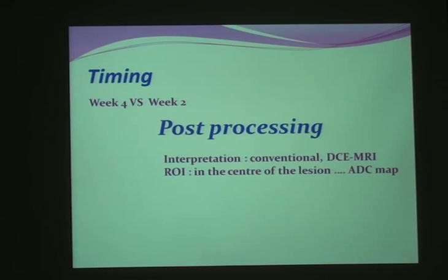So I have diffuse, high ADC value or no restricted diffusion, as we say. Yet we return to the dilemma we said before about the enhancement, if you remember. I don't need unnecessary enhancement in the breast tissue. So we just keep it with week 2, and there is not much difference except like 5.5% in the ADC value between different phases.